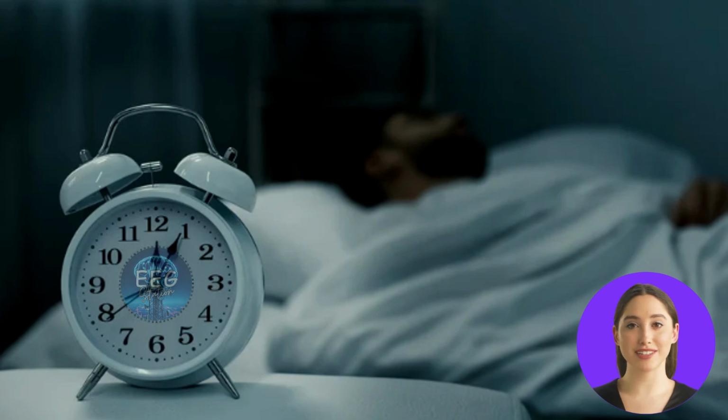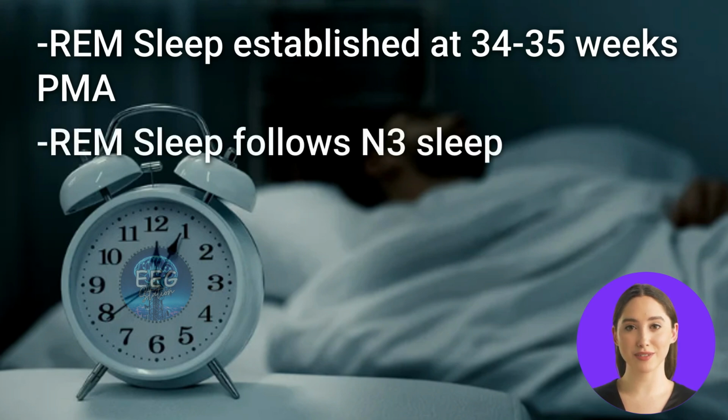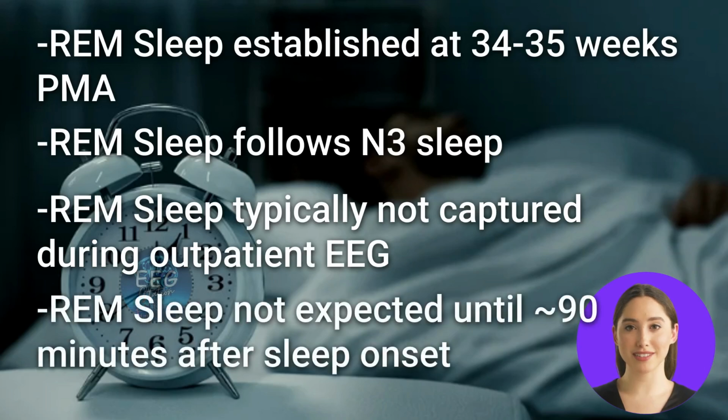REM sleep is first established as a differentiated state at 34 to 35 weeks postmenstrual age. It is a component of the sleep cycle which follows N3 sleep, slow wave sleep. REM sleep is typically not captured during outpatient EEG procedure due to the relatively limited recording time. Specifically, it is not expected until approximately 90 minutes after onset of sleep.